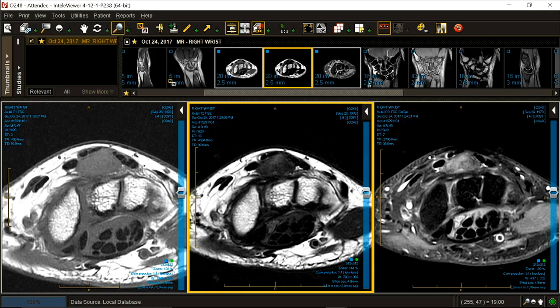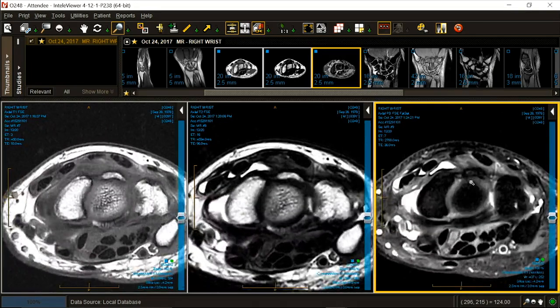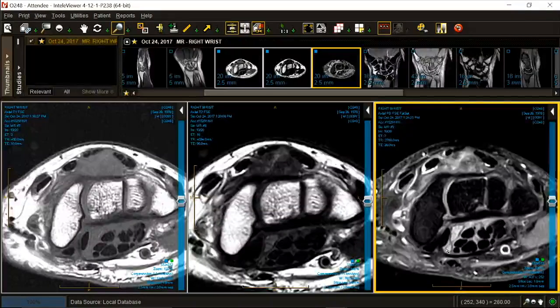So while you are debating the etiology and histology of this lesion, some of you who are more experienced might have noticed the patient has an anomaly. That anomaly is a deep, vertical, bifid median nerve. The median nerve, 75% of the time, sits here. 25% of the time, it sits between the FPL and the other flexor tendons. So this is one of those 25%, but it's also duplicated. It's a bifid nerve.